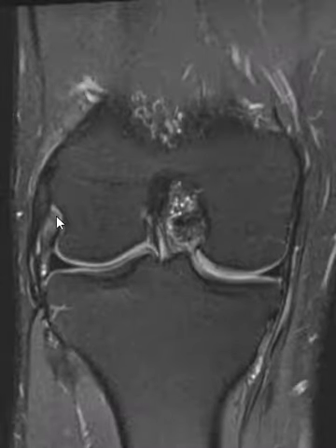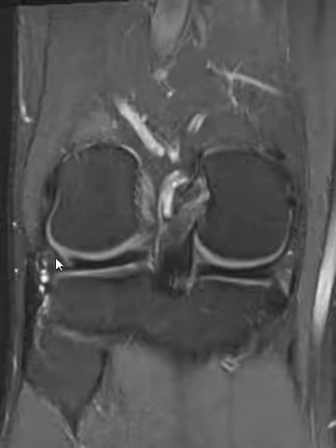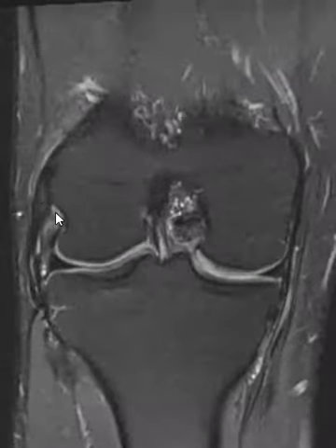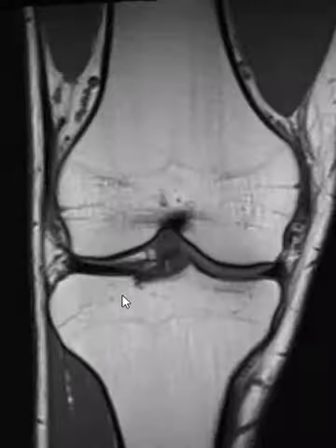And also beneath that, we see the popliteus tendon. It comes out of this little trough here. Popliteus tendon comes down, wraps behind underneath, right next to the meniscus here, comes obliquely down. You can see the central tendon fibers, and this is the muscle. And so they have a sprain of this fibular collateral ligament, and then also a strain of this underlying popliteus tendon. Kind of minor findings here, but just good for the basic anatomy.